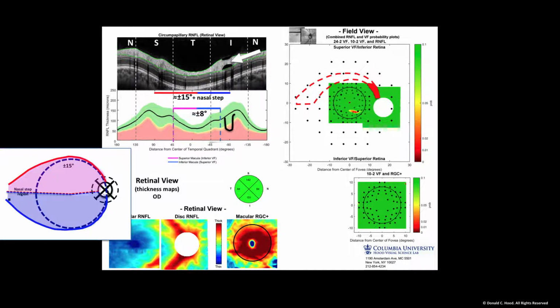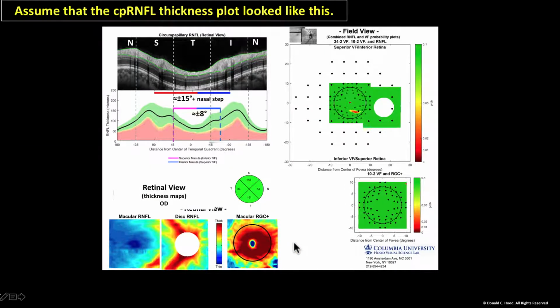Okay, so this, we'll put the model on top to confirm that. So what about this? And there, and there? Well, it should be fine because it's outside the macula. All right.